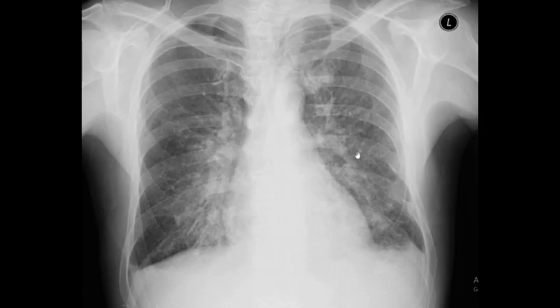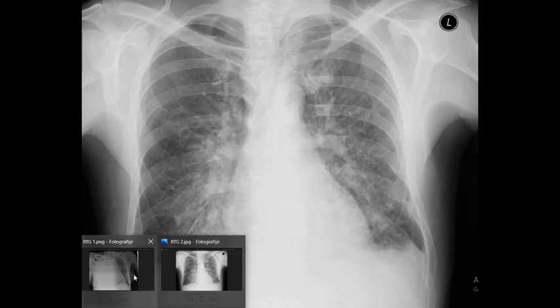Once you analyze many x-rays, the quantity is very important in order to differentiate, for example, the difference between pulmonary edema and pulmonary fibrosis. It is important to know these conditions, what causes them, and then to look at many x-rays. The quantity is very important to accommodate the eye. Once the eye accommodates, you will more easily distinguish between pulmonary edema and other conditions. So here is another x-ray.